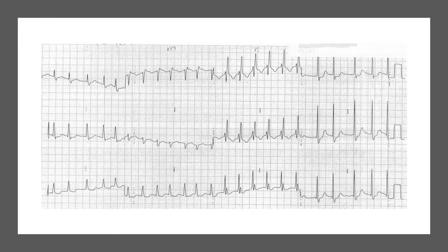Okay, so let's practice a couple examples here. So take a look at this one, evaluate it. Again, remember, you're looking at V1 and V6 only. You can ignore the rest for now, and take a look at it and see what you see.